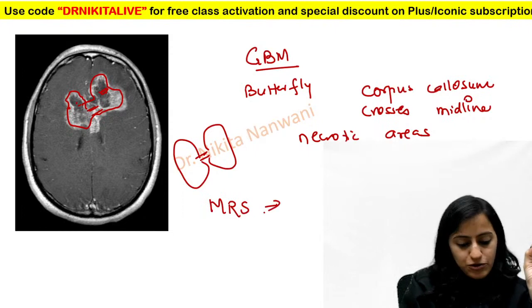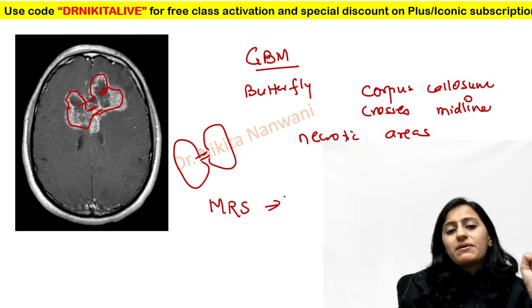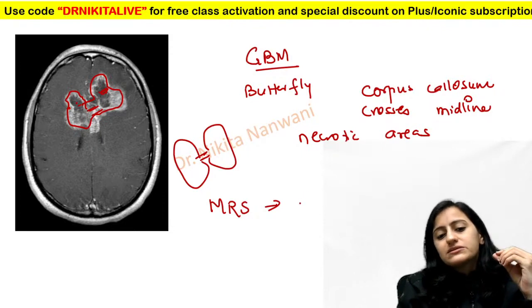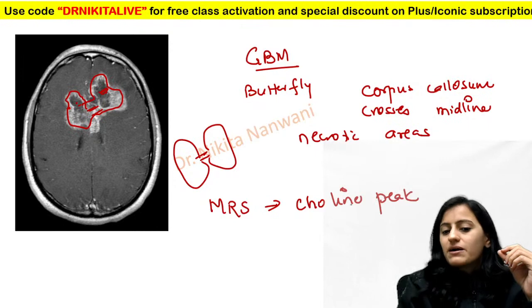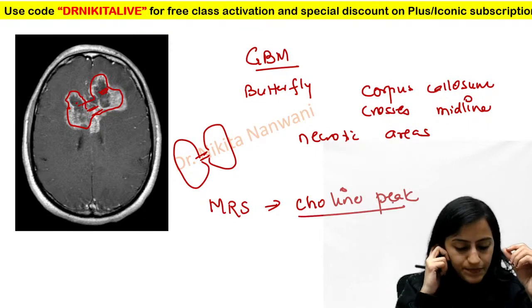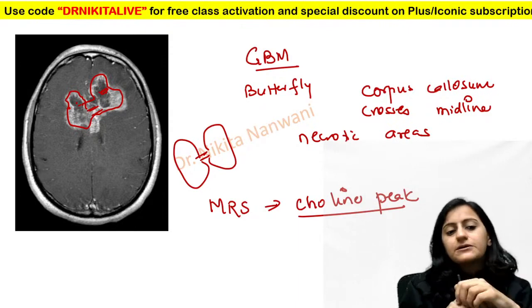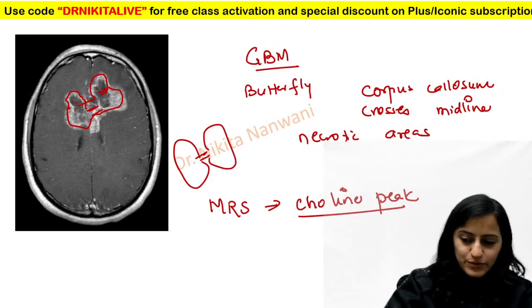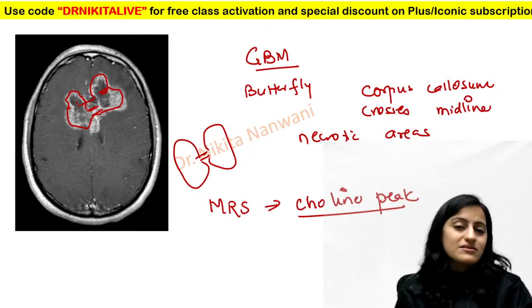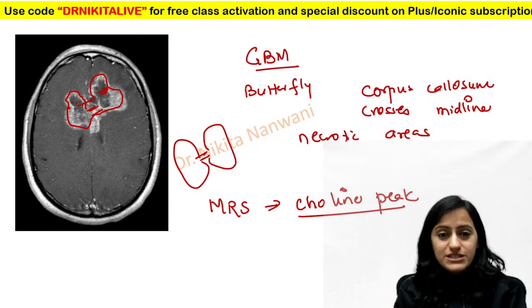On MR spectroscopy, what peak will we see? On MR spectroscopy, intraaxial brain tumors give a choline peak. Okay, on MR spectroscopy we will see the choline peak. So that is about neuroradiology, I think. We have covered almost everything, the very important images in neuroradiology, in a very short time.